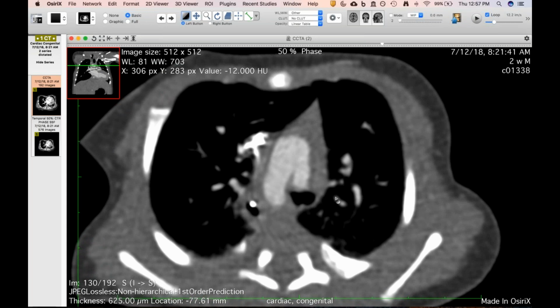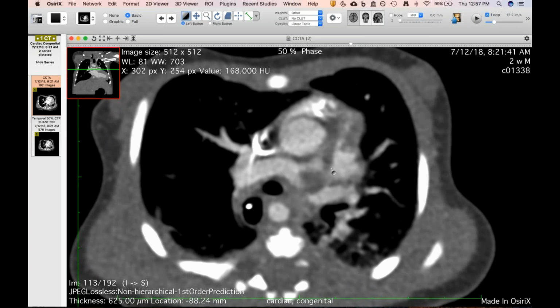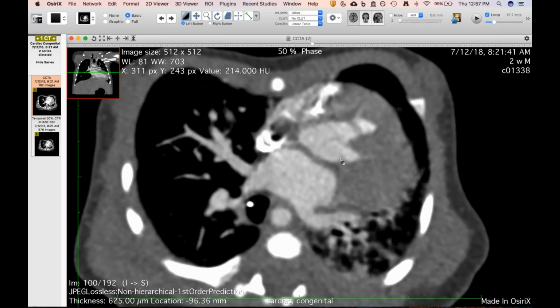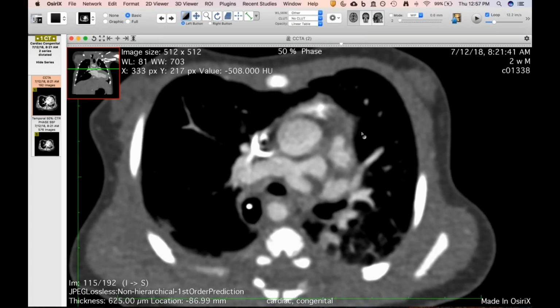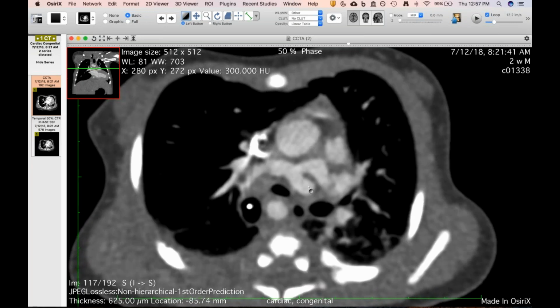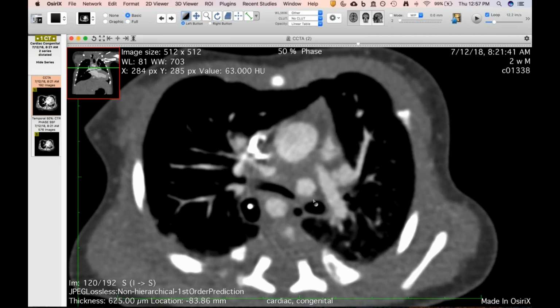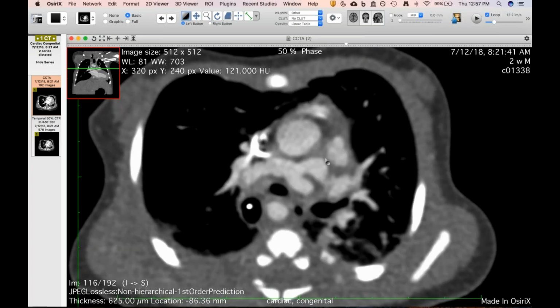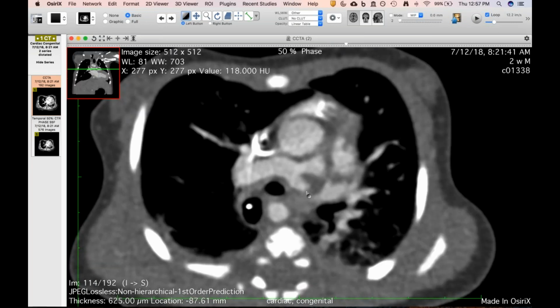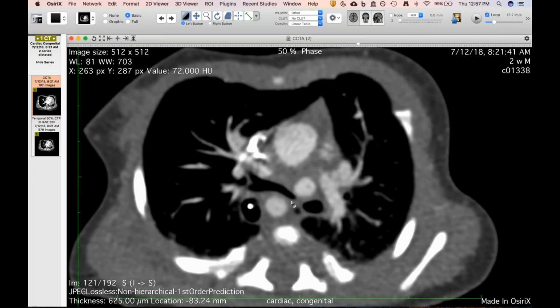But yeah, so this is just another congenital variant where this is a conotruncal abnormality with what we sometimes call a super TET, where it's tetralogy plus pulmonary atresia. So the pulmonary arteries have to be supplied by the ductus as they are in this case. So this one, hopefully they can repair, just close the VSD, create a conduit from the RV to the pulmonary trunk, and then maybe get this out of the way so that the airway isn't as compressed. But that was our interesting congenital case for this morning.